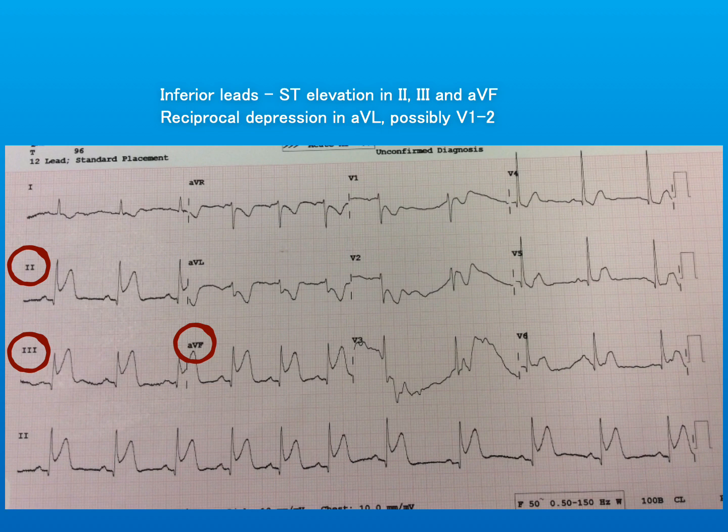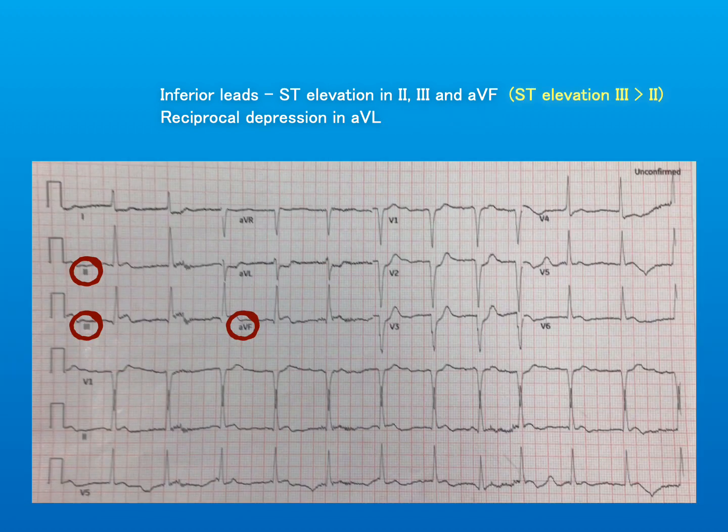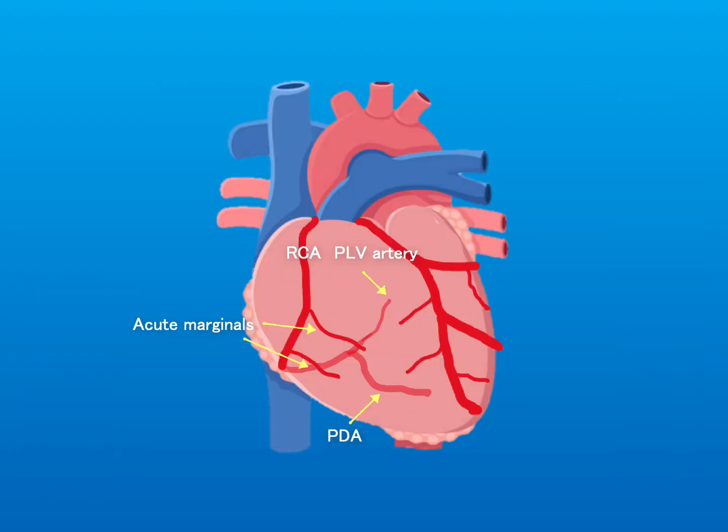And that's because the ischemia is more generally in a rightwards direction. You'll also typically see reciprocal depression in the lateral leads, so leads 1 and AVL especially. On the other hand, an inferior MI secondary to occlusion of the other coronary arteries is possible because of the different variants in anatomy. Usually we'll see right dominant anatomy.